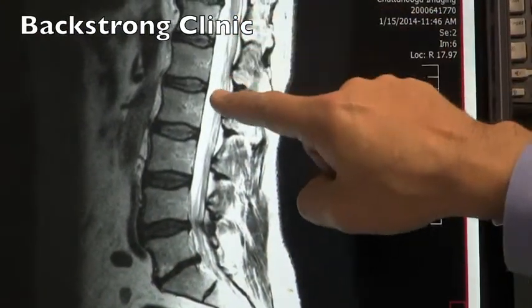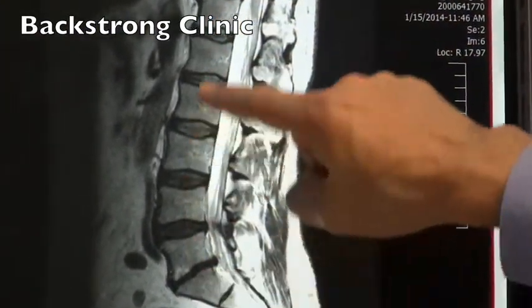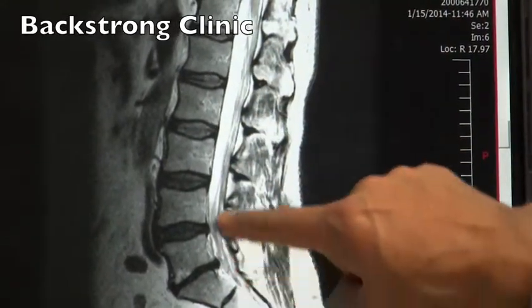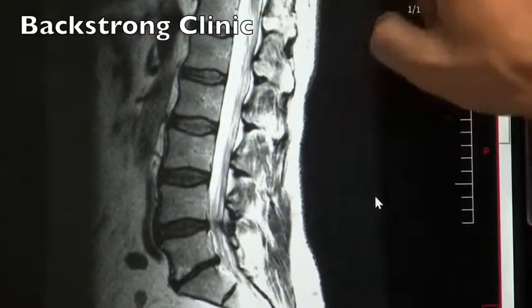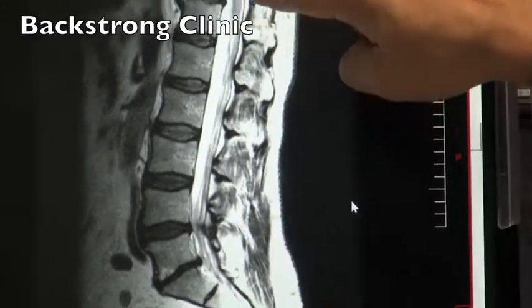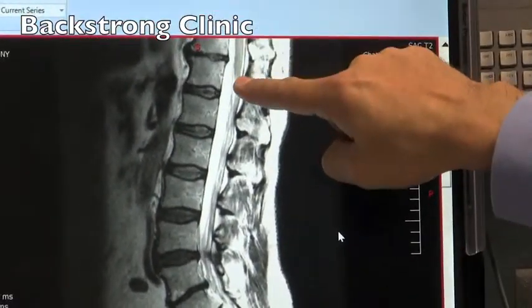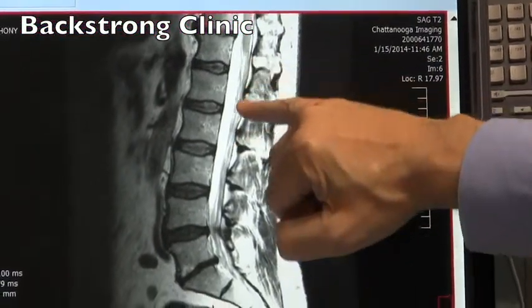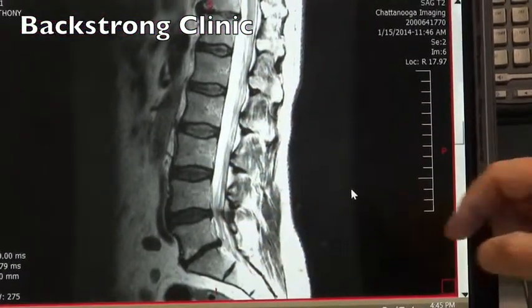This space back here behind the vertebrae and the discs in between the vertebrae, this space right here is the canal, neural canal or spinal canal. The spinal cord ends right there. You can see that gray stripe ends right there. Beyond that, these little lines are nerve roots, individual nerve roots coming down the neural canal.